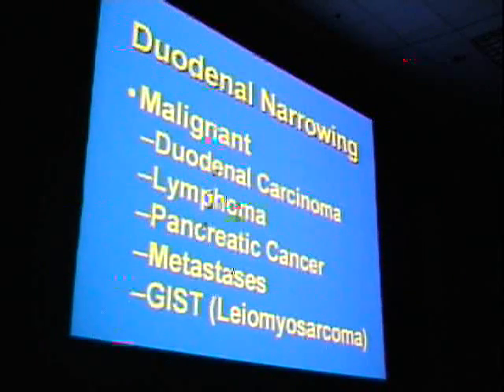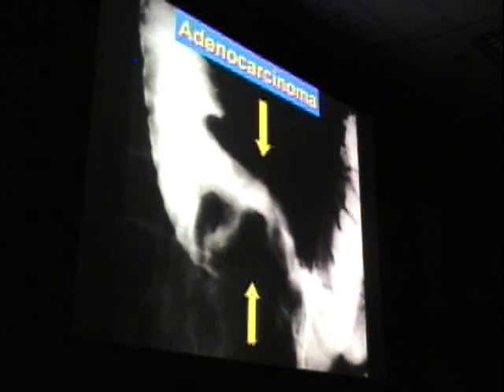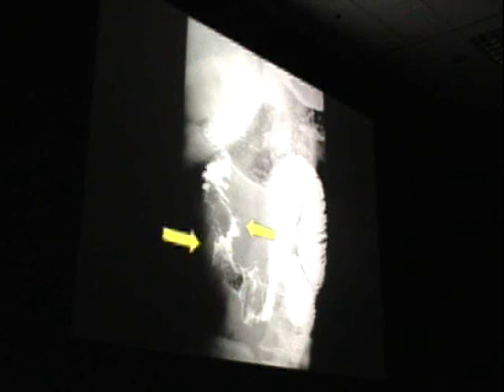This patient had severe pancreatitis with marked narrowing of the duodenum. Pancreatic cancer can also do this. We mentioned pancreatic cancer here; duodenal cancers, etc., are all part of the differential. The most characteristic appearance for a duodenal or small bowel malignancy, adenocarcinoma, is a short, constricting apple-core type lesion, as we see here. With lumpy bulky masses, the most likely thing is lymphoma, because yes, with ulceration, this is lymphoma.